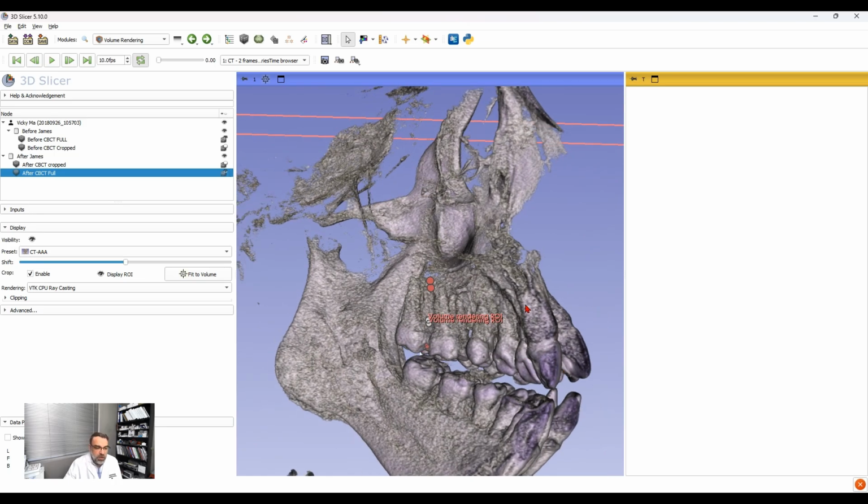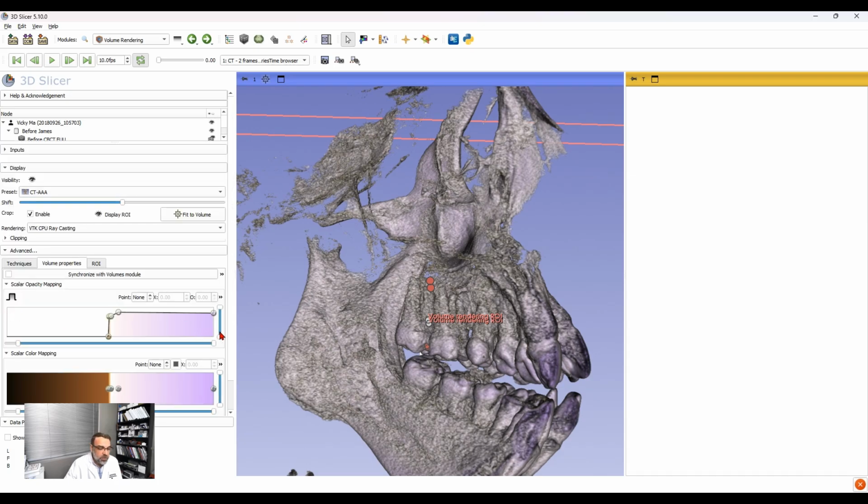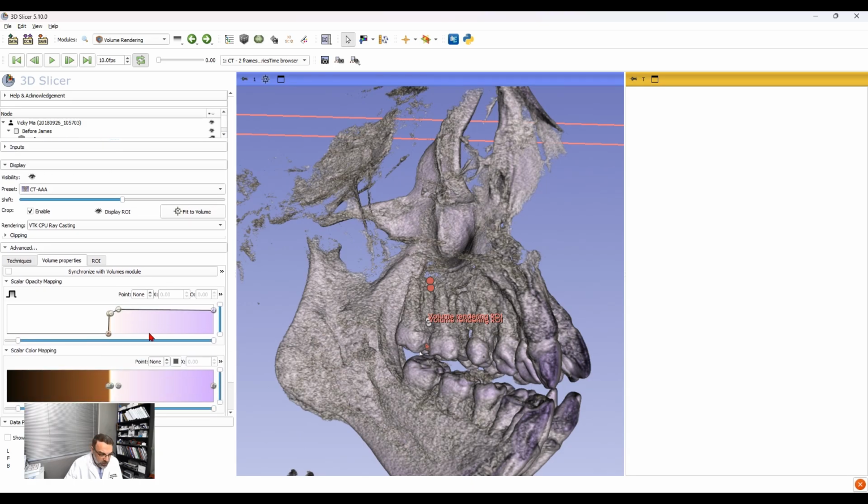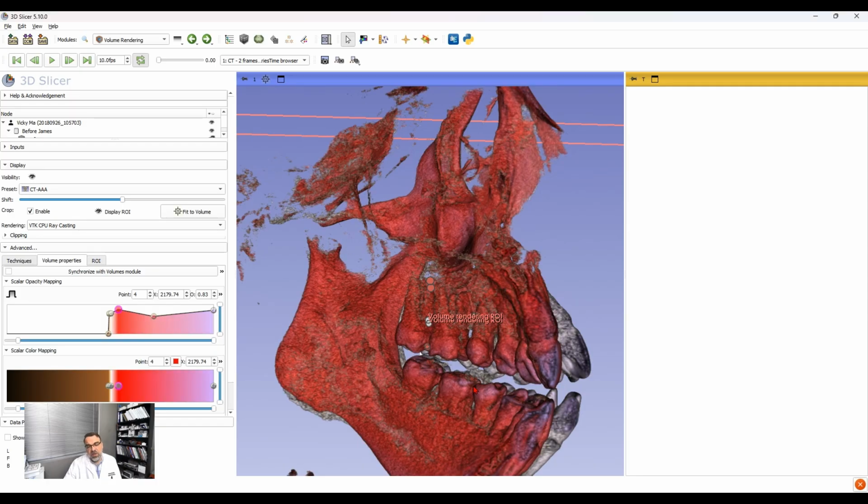You can also play right here if you want to distinguish before and after color wise. Like let's say we want to give some hue color. Let's say we will give it some green color. Go to advanced here. You see advanced, and under the after. So let's see if we're gonna pick this color here. What is this one? Let me change it to maybe red. And now you can see I have some reddish hue here. So this is after, that's before, okay?